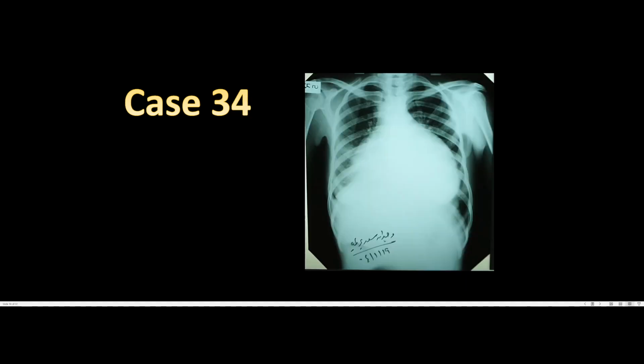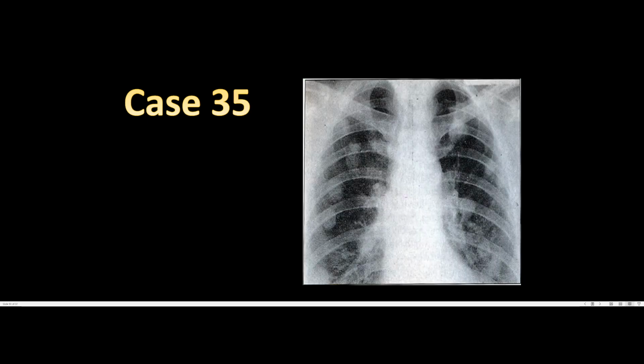Look at this one, spot diagnosis. Again, you might assume this is pericardial effusion from pericarditis. You might assume in a child this might be a tetralogy of Fallot, for example, if it takes on a boot-shaped appearance. A whole bunch of things, all right? We need the patient's history. You could say pericardial effusion, it's fine.